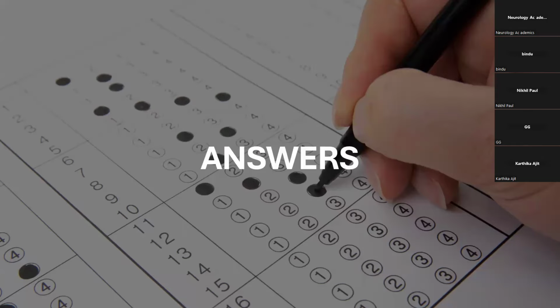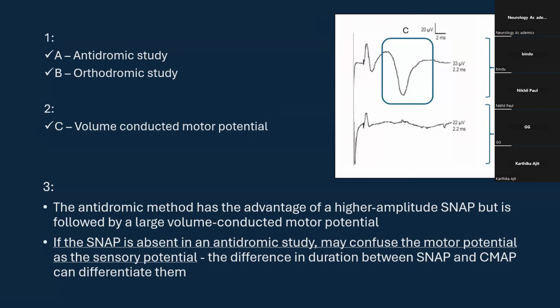A is something like stimulating at the wrist and recording from the fingers, and B is the opposite. A is the antidromic study. What is marked as C is the volume conducted motor potential. One disadvantage of the antidromic method is that if we do not have a SNAP, we may confuse that motor potential with the sensory action potential, so differentiating them might be an issue. So in this question, A is the antidromic study, B is the orthodromic, C is the volume conducted motor potential, and the disadvantage is that we may not be able to differentiate if the SNAP is absent.